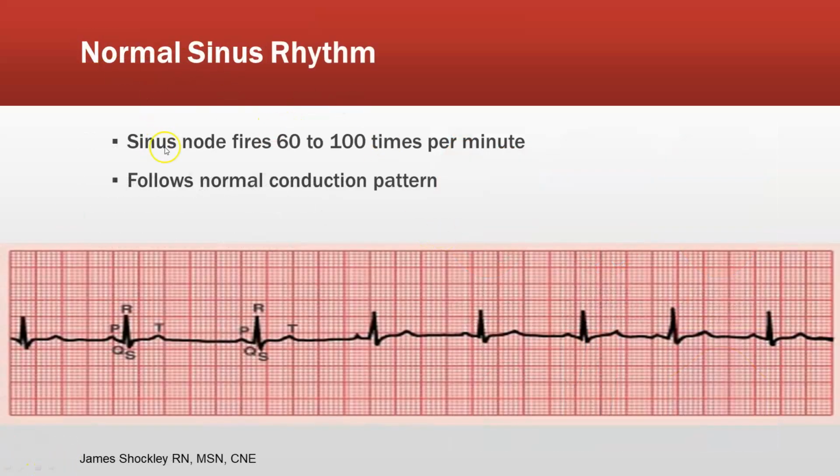So our first one, we see just a normal sinus rhythm. Again, each part of your PQRST complex is exactly the same. I could take this image and it lines up perfectly with this image. So make sure that I'm looking at my atrial rate, ventricle rate, PRI, QRS, QT, R to Rs.